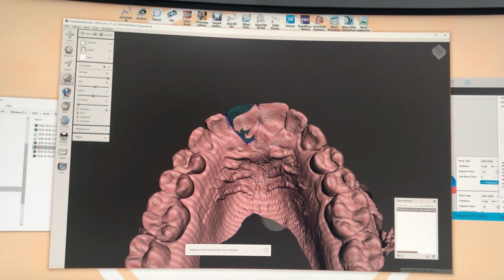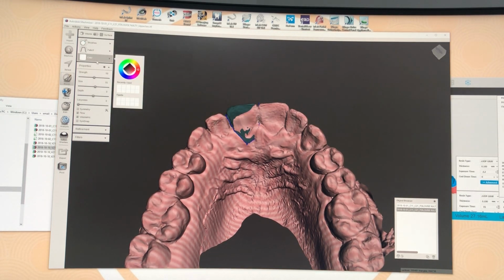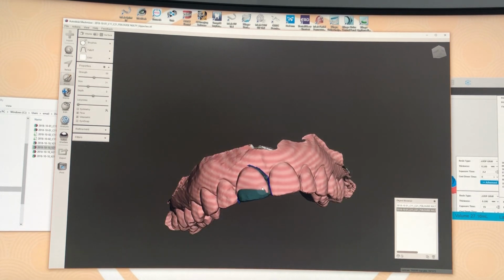reverse, go to Sculpt, Brushes, and instead of removing it, you're drawing it, but it's in reverse, so you're effectively removing it. So you can make this brush a bit smaller. Not that small. There we go. You can see then it's easy to just get rid of it, nice and easy. All good. Same at the front.